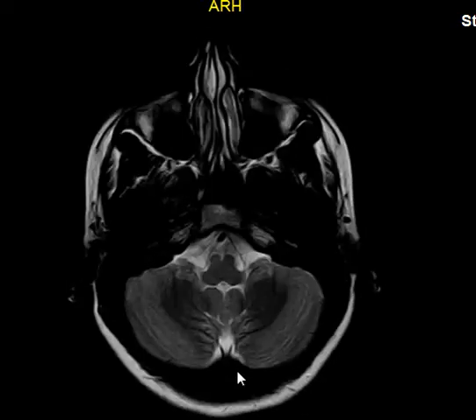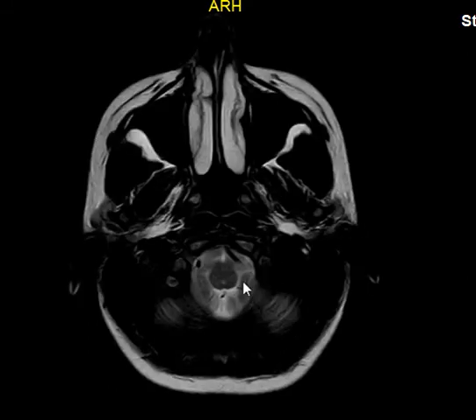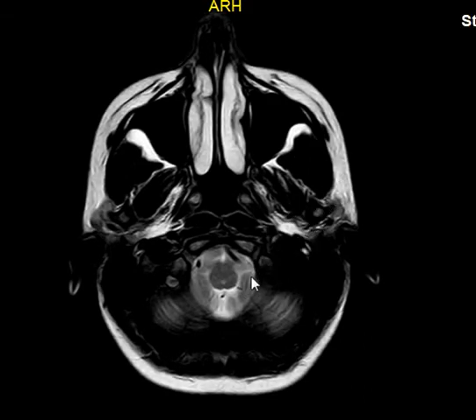And you have here in the midline, most important is the vermis. You just have to make sure that you see this most inferior part of the cerebellum that is surrounding the medulla oblongata and the upper spinal cord, which is called the tonsils. These might herniate and cause obstructive hydrocephalus or compression of the brainstem. Here, this tiny thing here.